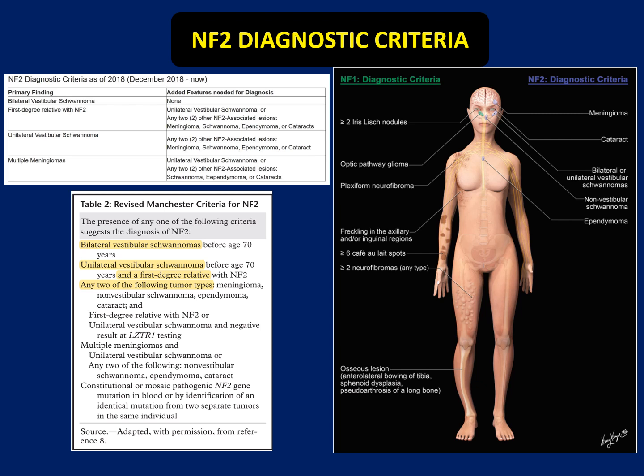So coming to the diagnosis. This patient has bilateral vestibular schwannomas. So the diagnosis is straightforward. It is a case of neurofibromatosis type 2.